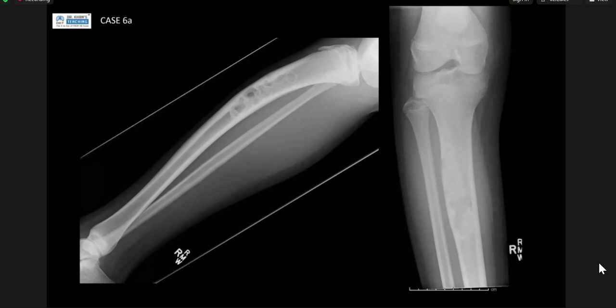The lesion shows well-defined sclerosis in the frontal radiograph. So this is a mixed sclerotic lytic lesion in the mid-diaphyseal, metadiaphyseal region of the tibia, with some asymmetry in the knee joint and frontal bowing of the tibia. So if the patient had a fever, I would put infective etiology as the first differential.